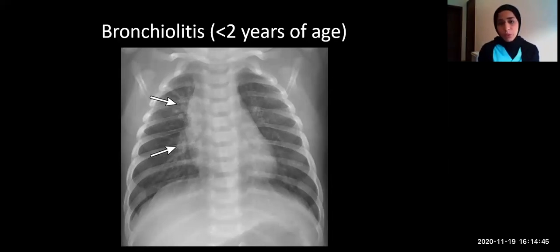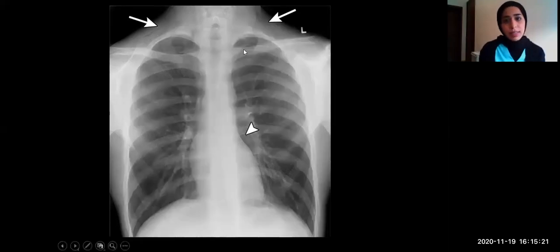The aim of reviewing these is not only to diagnose, but also you need to exclude the major complications of these entities which cause hyperinflation of the lungs. With hyperinflation, you may expect rupture of the alveoli, associated pneumomediastinum and pneumothorax, which are life-threatening conditions. So, moving here, this was an asthmatic patient with acute exacerbation and shortness of breath. And if you can see here, you can outline the abnormality within the search areas which we reviewed.